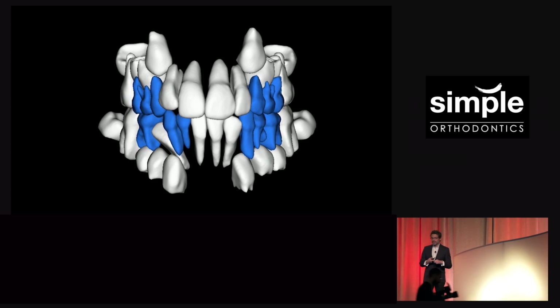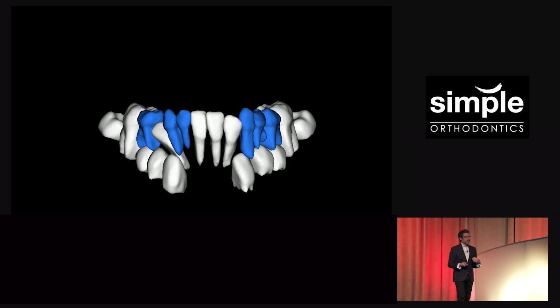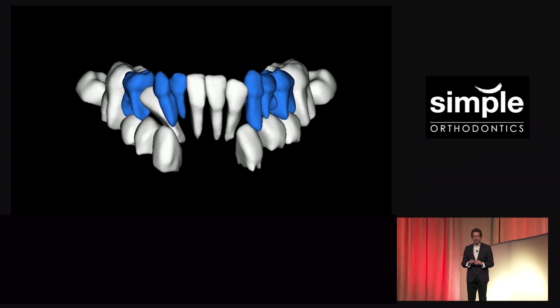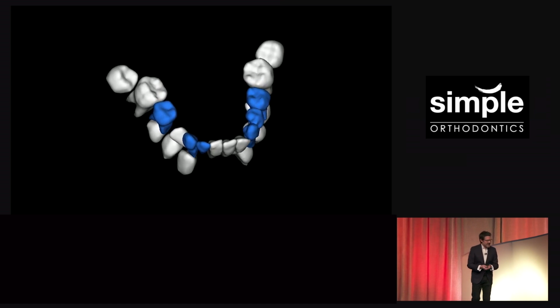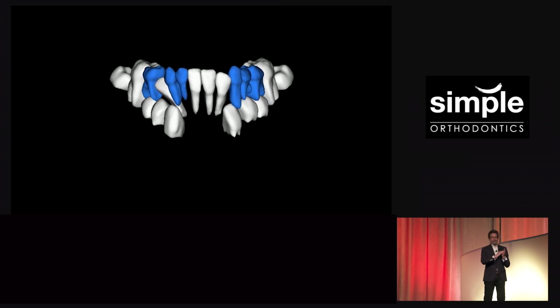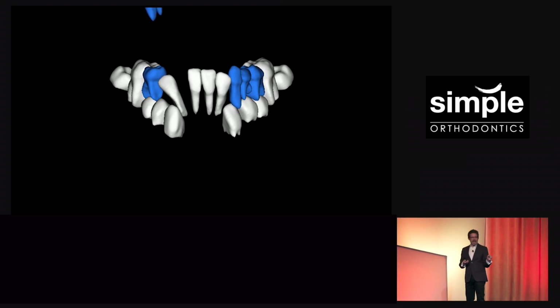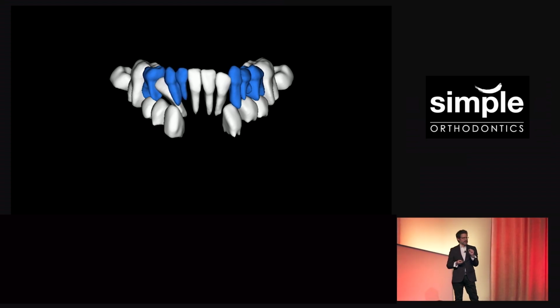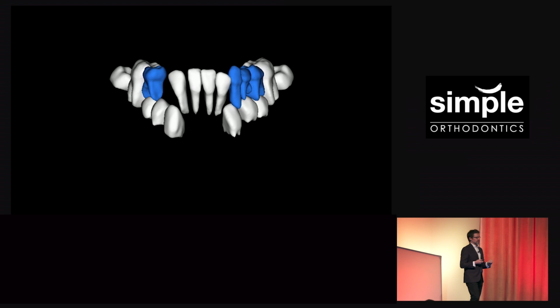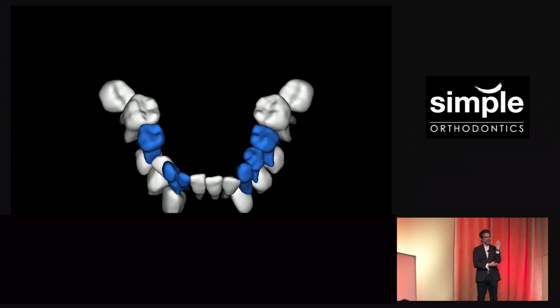Without this model, all of us can see that the tooth is off and there's a potential transposition happening here. But for me, without this model, it's really hard to determine what my mechanics need to be to get that lateral incisor where it's supposed to be. A lot of us think, just put something on it and just tip it. What I want you to notice from this rehearsal on Annabelle is how much apex movement has to happen, how much mesial movement of the apex. This is bodily movement of the lateral.